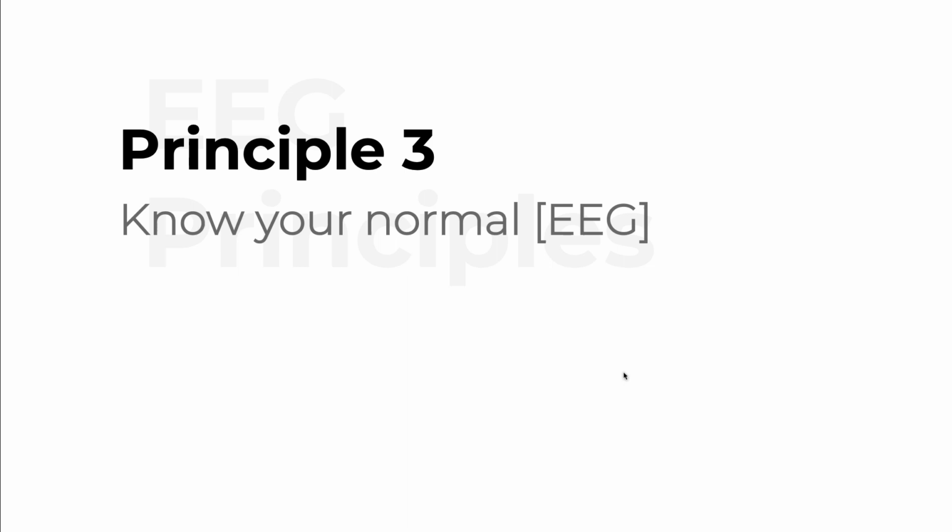The main principle I want to introduce to you during this lecture is know your normal EEG. Normal EEG is the anchor point when you're reading studies that will help you understand what you are seeing and will help you make sure that you do not overcall abnormalities.